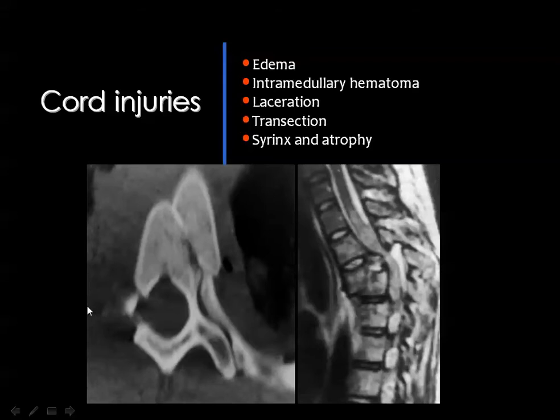Then this is the severe type of dorsal spine fracture with fourth degree spondylolisthesis of one of the dorsal vertebrae, which has become in front of the lower one. You see the marked deformity of the spinal canal with diffuse high signal intensity of the cord in T2 weighted images denoting the presence of cord edema.